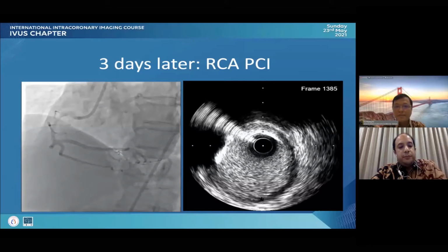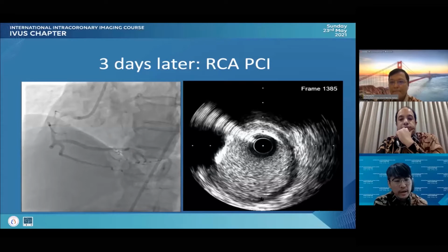Thank you. I think the culprit lesion is the LAD. The RCA is a non-culprit lesion, and the area is quite nice, so I think physiology assessment is one option.